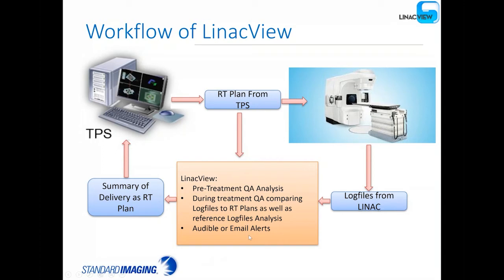Afterwards, you can analyze a particular session and acquire an RT plan that you can put back in your treatment planning system if there were variations that occurred during the particular treatment. Or after all of the fractions are delivered, you can create a summary plan of the entire session and feed that back into your treatment planning system if you do get any alerts or failures.